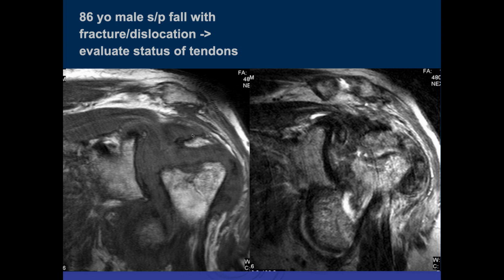It looks like there's some intact though. I don't see fluid, but the different tendons were intact to the bones, the bony fragments that were displaced.